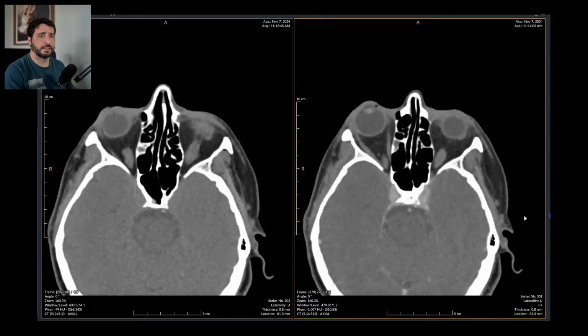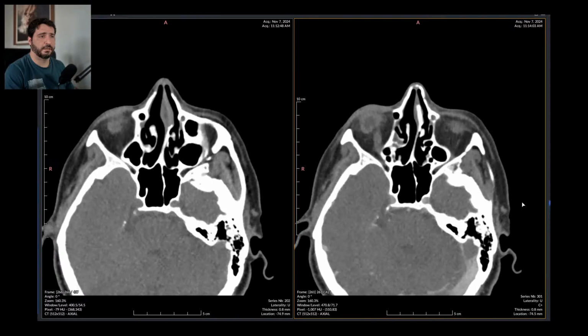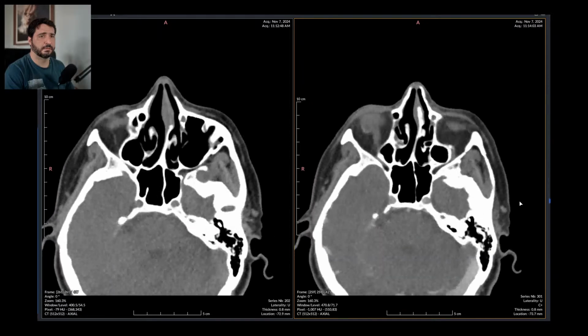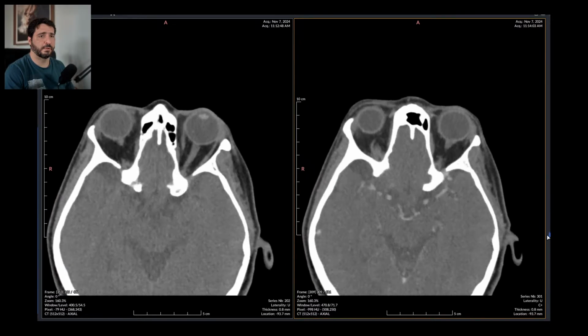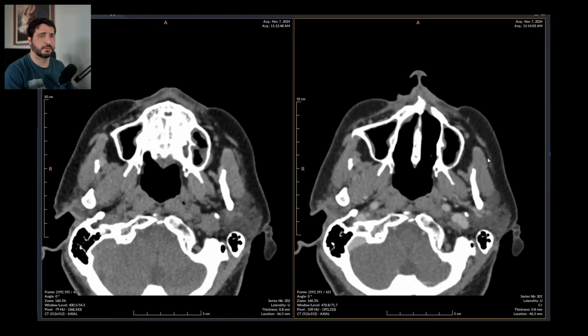And it says she had some kind of nose surgery and radiotherapy. I could never tell. It seems her nose is fine to me. Nose is right there. Seems normal. Maybe there is some kind of thickening right there on her nose.